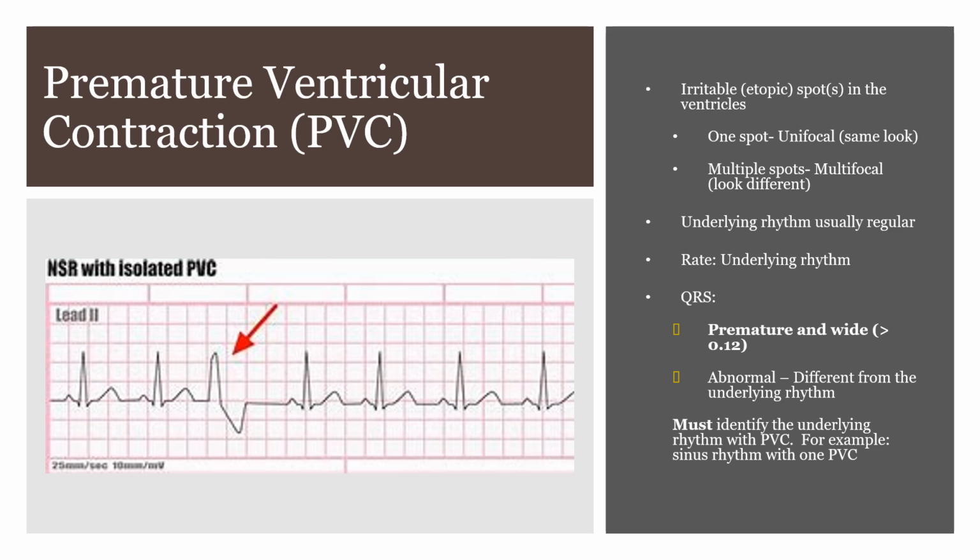So premature ventricular contractions. In our examples we're going to be looking at premature ventricular contractions, or PVCs, with an underlying rhythm that is a sinus rhythm. So a sinus rhythm, a sinus bradycardia, or sinus tachycardia. In the outside world, we can truly have a PVC with any kind of underlying rhythm, but we're going to be looking at identifying them in a basic strip.